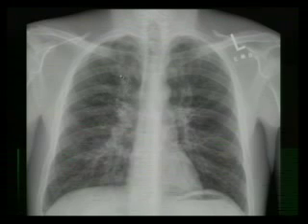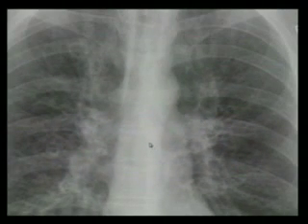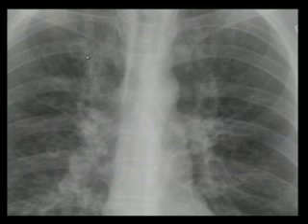Here you have bronchiectasis. You have big pulmonary arteries. These pulmonary hila are big because they get pulmonary arterial hypertension. Anytime you have chronic interstitial lung disease, you're going to get pulmonary arterial hypertension. They can also get adenopathy from recurrent pneumonias. There's another bronchiectasis here. So what you want to look for, the lungs are going to look nasty. You just want to look, are there new opacities? Are there cylindrical looking opacities that can be mucus plugging? Is there more whiteness up in here that could be a superimposed pneumonia?